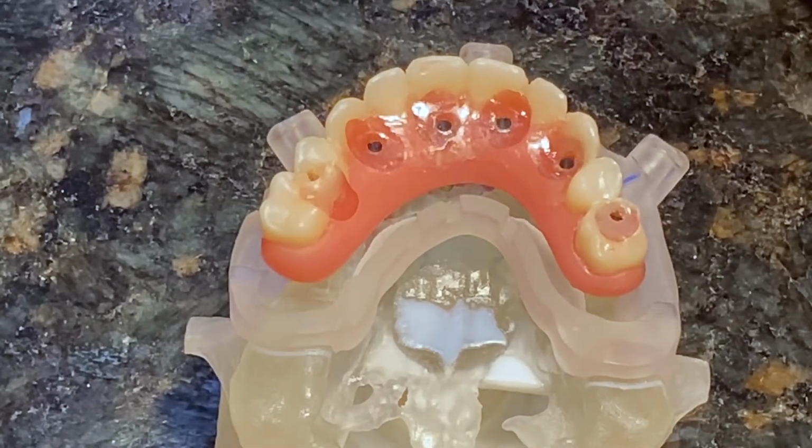It really is a game changer, because having done this now for 20 years myself, attaching teeth to implants at the time of the placement of the dental implants, without this level of precision and planning, it was a long, somewhat inexact procedure where we would have to make adjustments on the fly, change parts out.